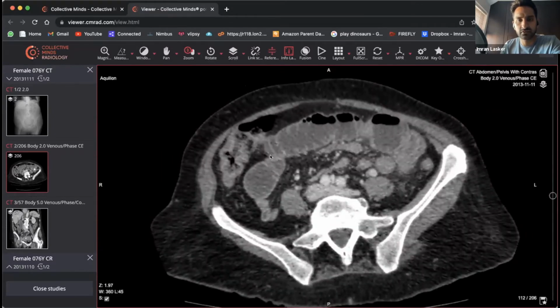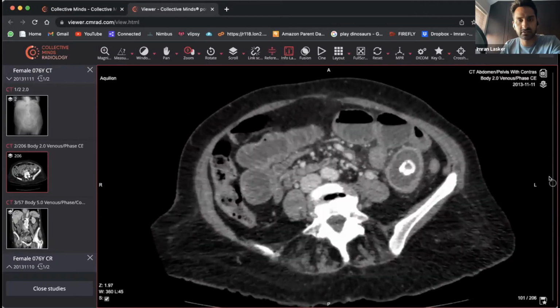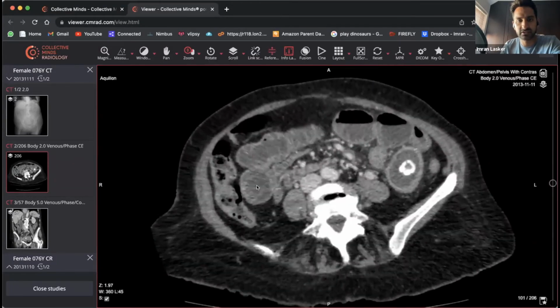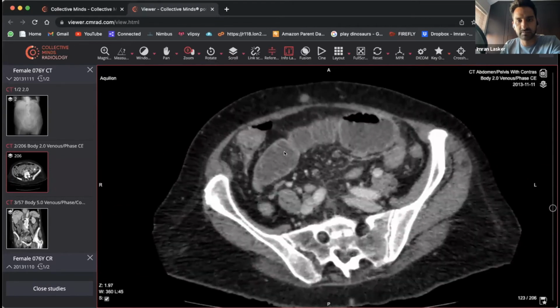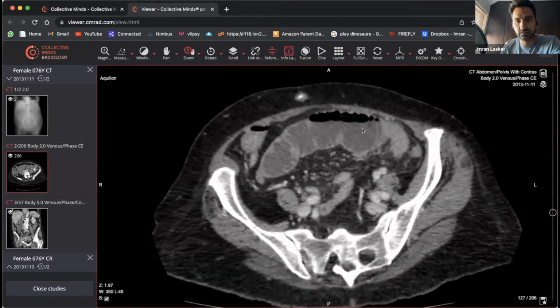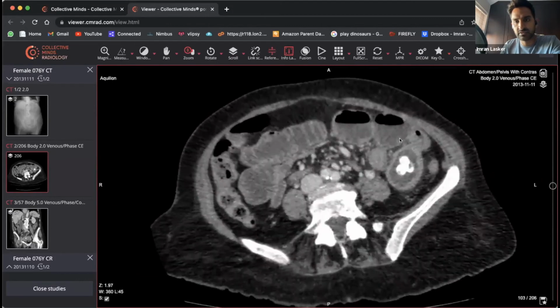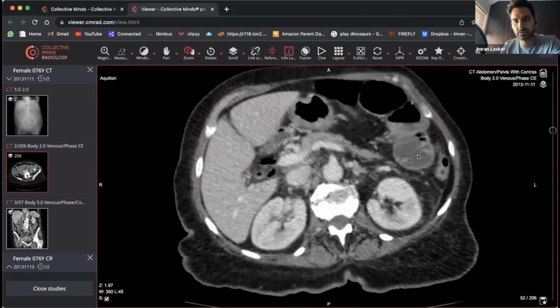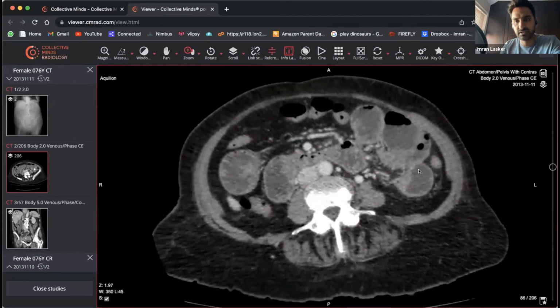Then you scroll through that way. You're scrolling through, so your eyes are somewhere around here, and you're coming up to this region over here, maybe. I'm going to just keep my mouse, keep following. Look, that goes that way, all the way that way. We're coming up to this region over here, all the way. So we're going upwards. Oh, it connects down here, coming all the way down.